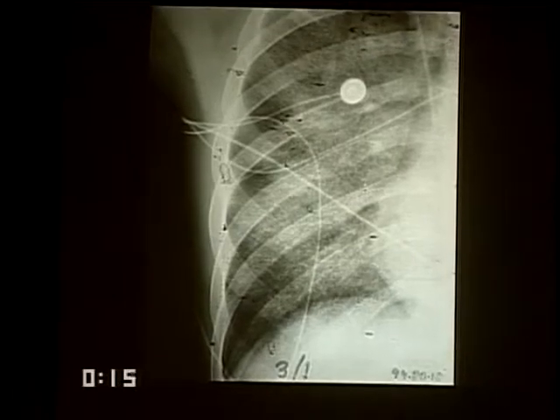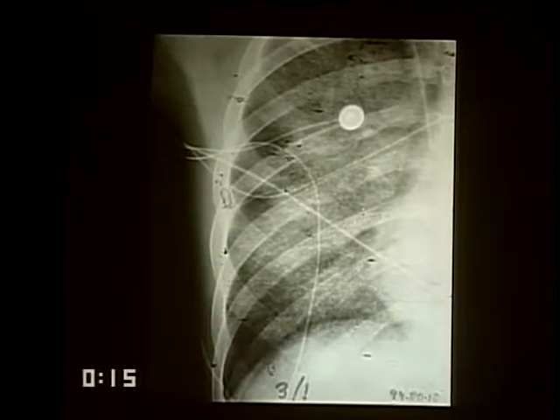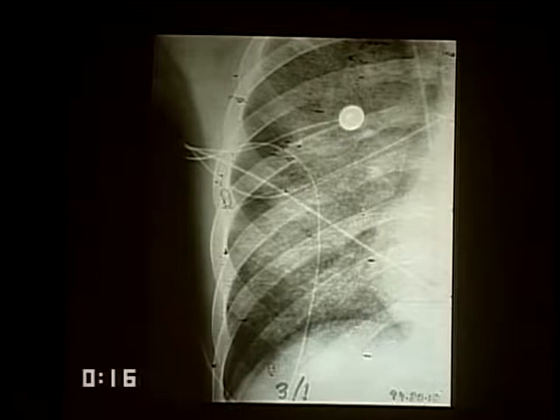Two examples of medullary distribution of interstitial disease, almost confluent, very finely nodular, as in this particular case here. The periphery spared, here again the periphery spared. This is PCP pneumonia, which quite commonly will be in this particular distribution.